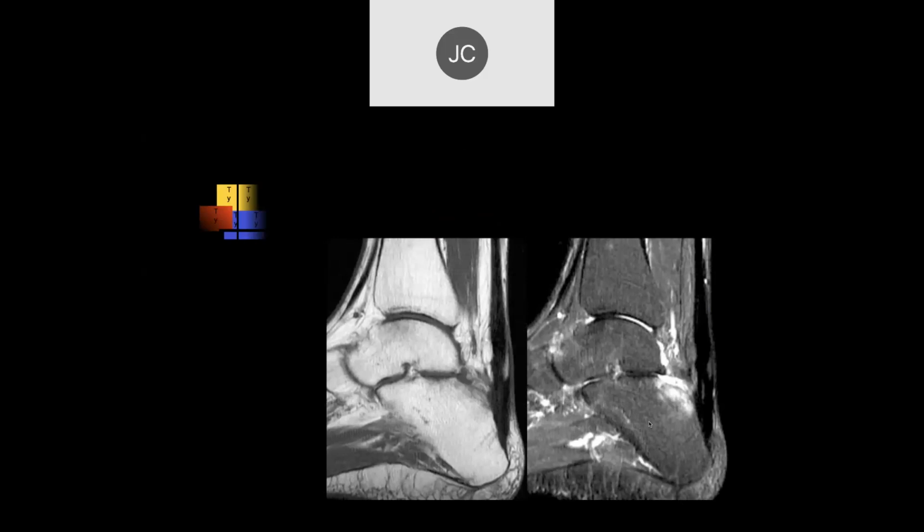Okay, Elior, what do you think of this case? Right, so we see thickening of that Achilles tendon with maybe a low-grade interstitial tear. And I see edema within the posterior calcaneus there. So again, that's probably due to traction injury, and we call this insertional osteitis.